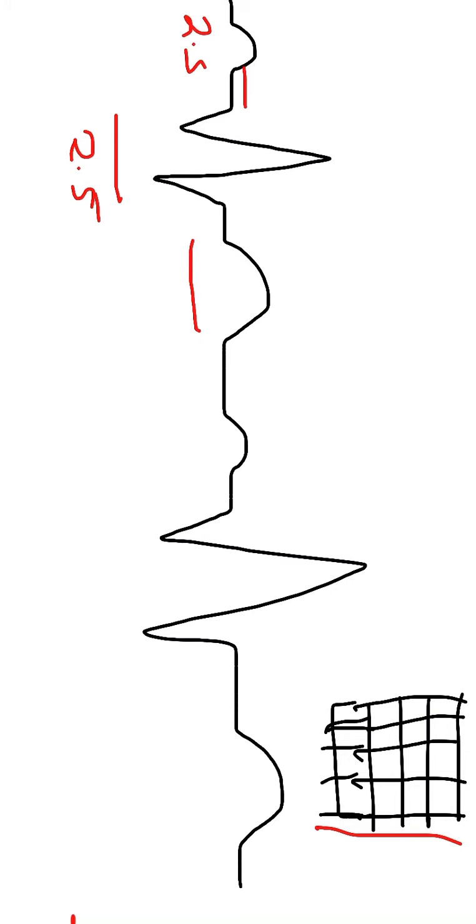All right, but what I am going to give you is that the entire ventricular activity, okay, that's depolarization up to the end of repolarization, takes about 0.4 seconds. All right, so all the way from here up to here, that's 0.4 seconds.